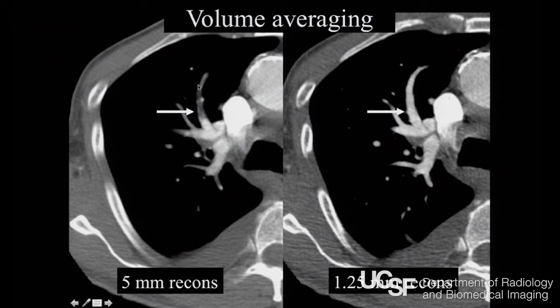And this is just because the vessel is running a bit obliquely to the scan, right? This part, which is well opacified, is in the middle of the scan. This is volume averaging with lung. Kind of looks like it could be a defect.